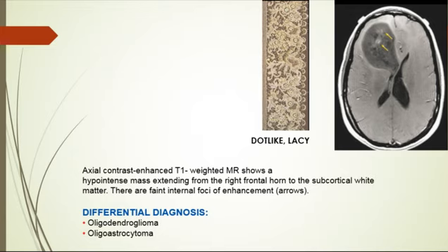Okay. Other imaging features include calcification and occasional hemorrhage, but it's very unlikely that hemorrhage or calcification can take this appearance. It's usually either oligodendroglioma or oligoastrocytoma. Okay? Vessels, but vessels are not present with the mass-like lesion. Usually shows calcification. On CT scan, it shows calcification, exactly. The malignant tumor that causes calcification is oligodendroglioma, so bubble appearance, exactly. That's the most common. Okay?